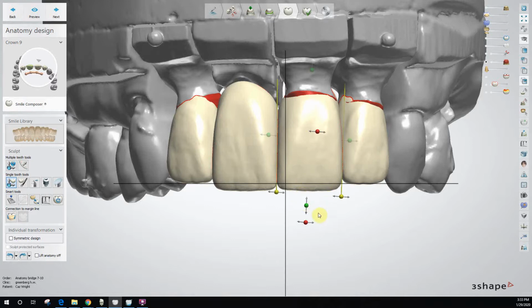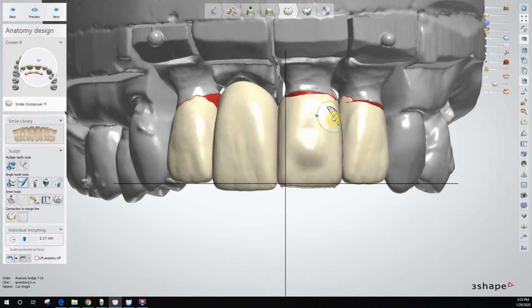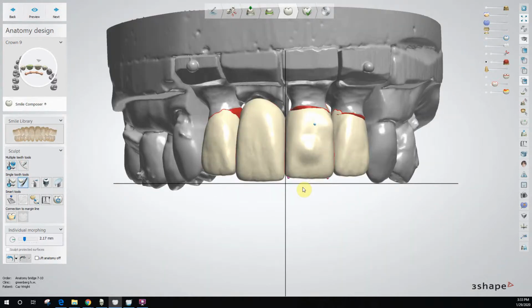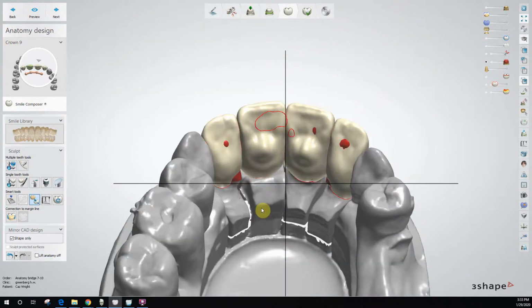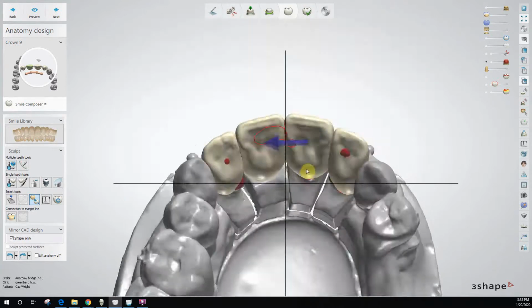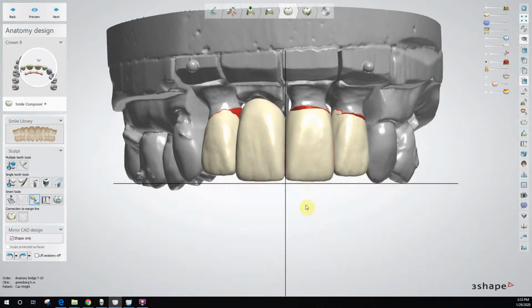Sometimes what I'll do is I'll make a bunch of changes to one tooth. I'll make the changes I want to make to it. And then once I make all those changes, I hit the mirroring tool and it'll make all those changes, okay? But there's a bunch of tools you can use to maintain that 100% mirrored, basically keep things uniform, okay?